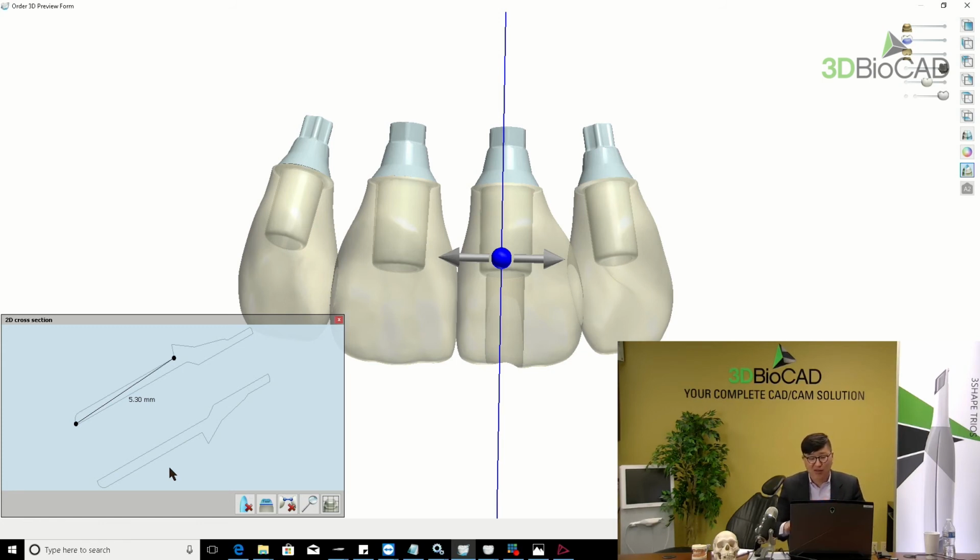temporary cylinder already. So I deliver to doctor to do the surgery, just follow the surgical drill guidance well, and maybe the depth can be a little bit different. Because always the doctor wants to check at the end of the surgery if the depth is good or not, maybe a little deeper or not, final top more or not.